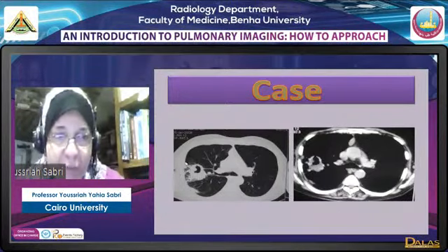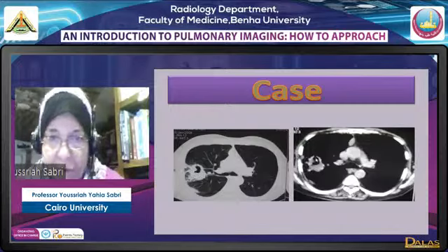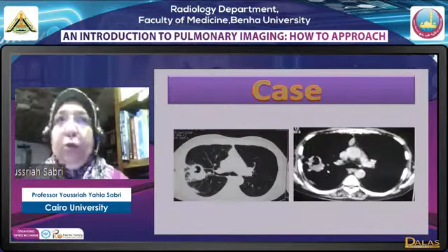اوكي we have this bronchogenic carcinoma with a cavitation. المنظر ده له differential diagnosis which is very important اللي هو an abscess.